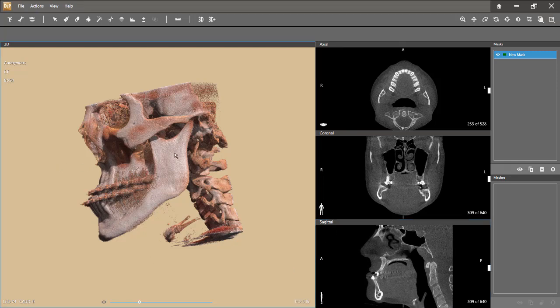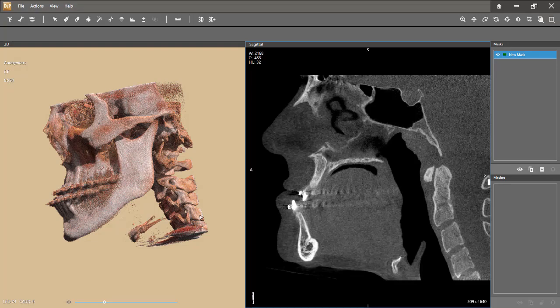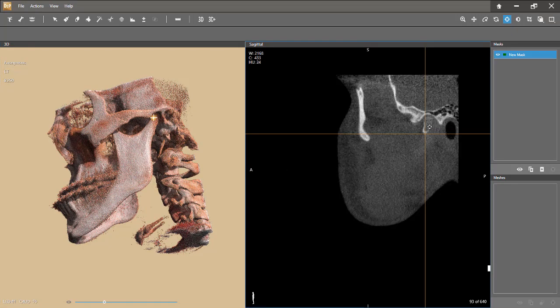The goal in this demo is to segment the mandible. For that, I don't need those three views. I will just ask for a different view setup, only two. The axial view is not the main, the good one, so I will ask for the sagittal one. First thing to ask here will be to synchronize those two views. To be sure, I will choose the starting point. Here is my synchronize button, and I'm just putting it on the top of the mandible. I know I'm here.